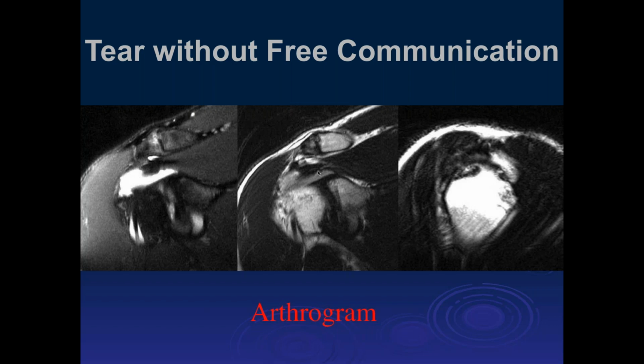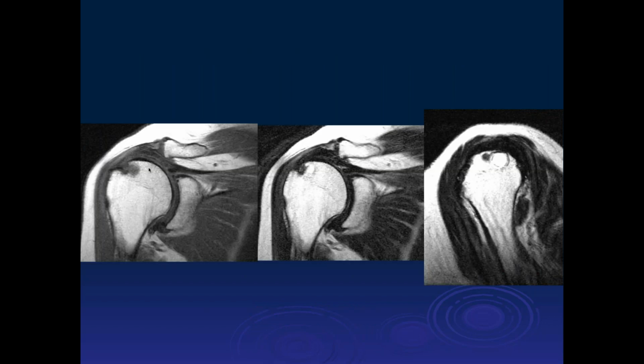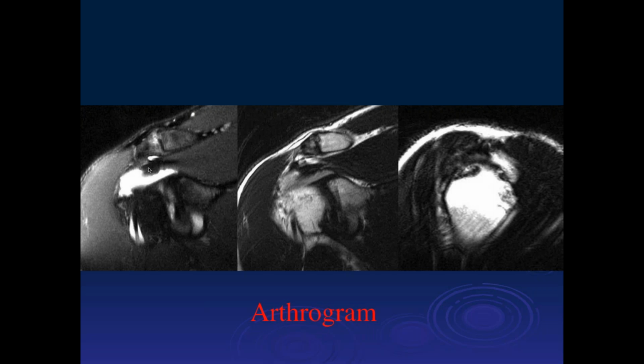So just be aware that anything that can happen will happen at some point when you're doing things, and don't be too confused if every tear doesn't read the book. And that didn't have anything to do with the patient having well-developed muscles. It's just random scar. No, or it does have to do with big muscles.